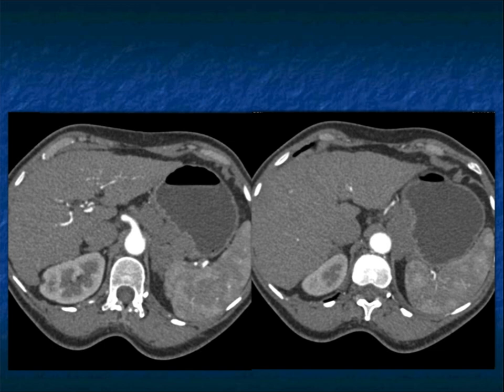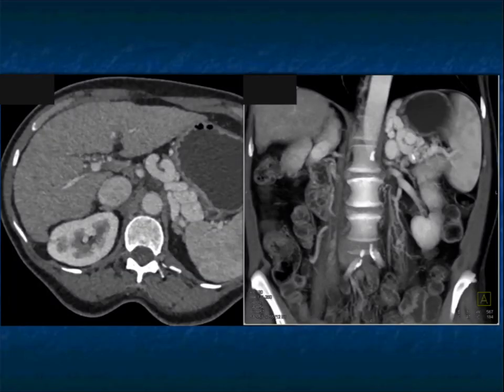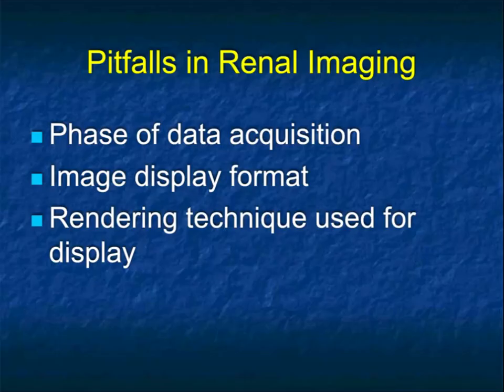Arterial phase imaging is great for picking up hepatoma, but you don't often see varices, and then you could call things nodes or call things masses, like this tail of the pancreas, which simply is not even the pancreas. It's all varices in a patient who has significant varices and portal hypertension. You can see the varices very nicely on the 3D as well. So it makes the point that when you have a cirrhotic liver, before you start calling nodes or masses, make sure you have venous phase imaging. Okay, that can be very important.